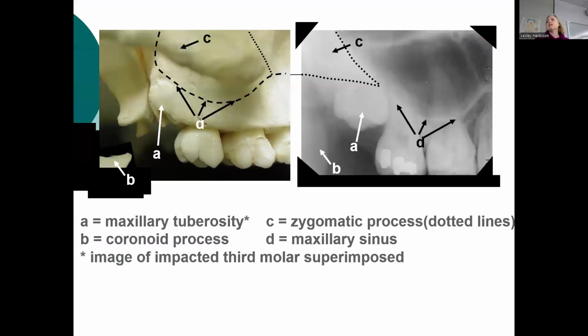So we'll look at some things here. Like here on the skull, it's pointing to the bone, the maxillary tuberosity, but here that's an unerupted tooth and it looks like it's pointing to the unerupted tooth. I always think this picture is kind of confusing, but this is unerupted and there would be tissue and bone there. In clinic, we would call that the maxillary tuberosity, even though there is a tooth embedded in the bone that hasn't erupted. Some pictures don't have that, but this one does.